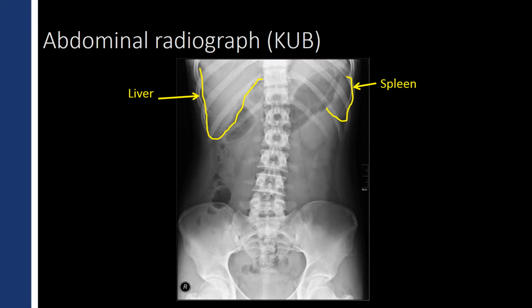And when you train your eye, usually we can see the kidneys, either most or all of the kidneys. And the reason we see those is because the kidneys are outlined with fat. And remember, the fat next to the water density creates that interface. Now, that being said, sometimes portions of the kidneys are obscured by overlying bowel gas or bowel contents. So we can generally see kidneys.